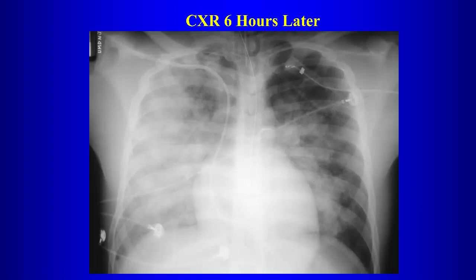Well, no, when we discuss pulmonary edema, there are two basic categories, right? What are those two categories? Cardiogenic and non-cardiogenic. So which would you favor here? Cardiogenic. Why would you favor cardiogenic pulmonary edema? Actually, non-cardiogenic, because the heart is normal in size. So there you might favor non-cardiogenic pulmonary edema.